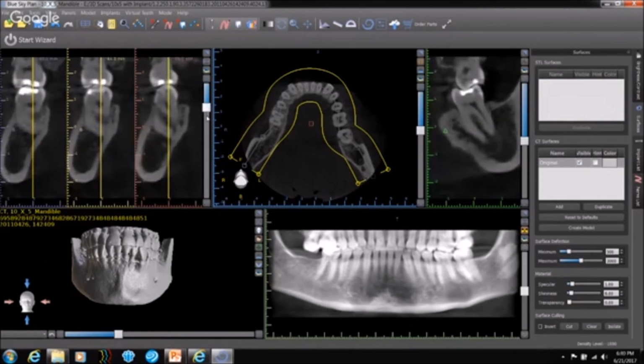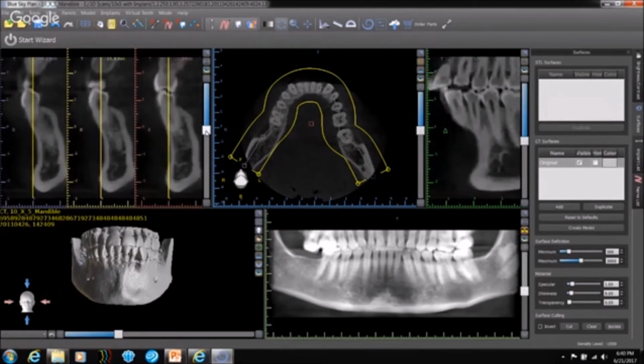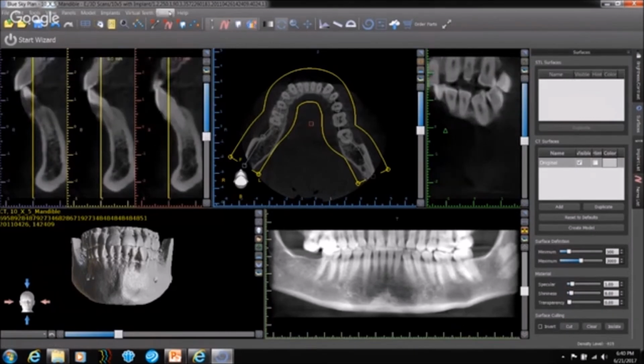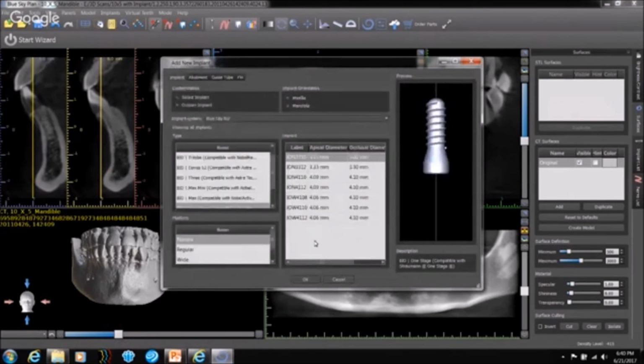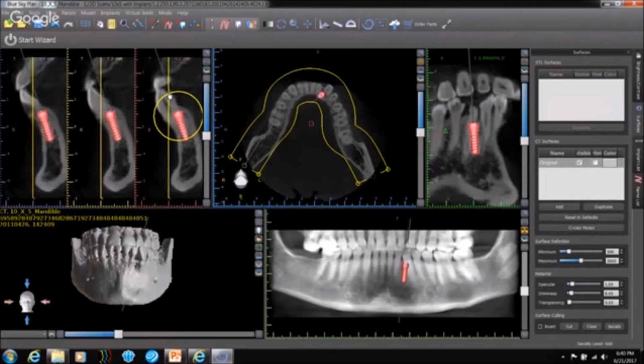And once you do that, you identify the slice, and hypothetically, I'm just going to pick, for example, just right over here, you click on the implant, it loads up a whole, and I'm randomly going to pick an implant, to all the relevant factors that I mentioned, which is basically containing it within the crestal, within the buccal and the lingual cortical plates, making sure the angulation is oriented according to the way you're planning to load the implant.